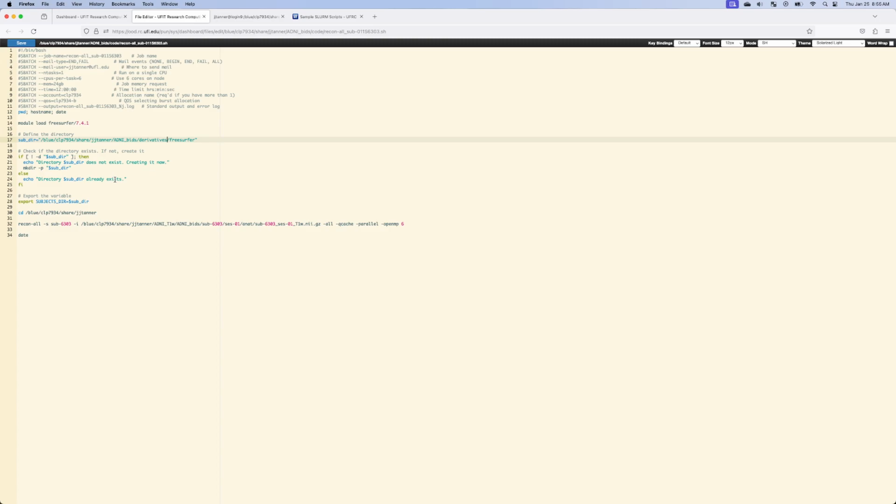So in the script, you don't have to do anything other than change this path. Again, don't put it in my directory, put this in your subdirectory, and that's going to be the case everywhere. Make sure that you are changing this to match your Gator link, and then make sure that this matches the name of your BIDS directory for these ADNI participants. Otherwise, you can just change those two things to match what they should be for you, and then the rest would be taken care of.